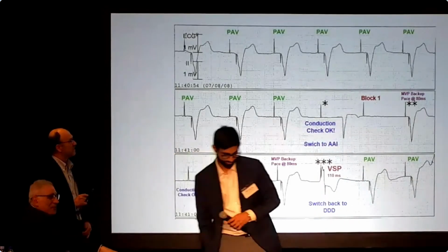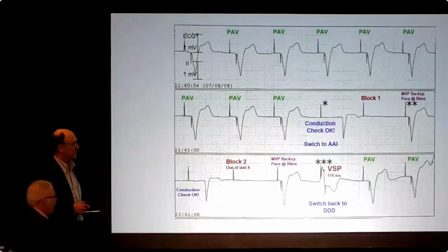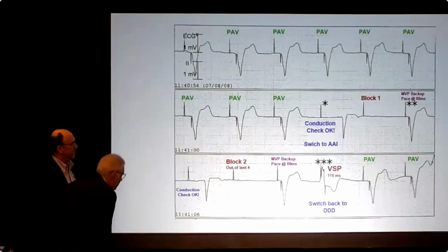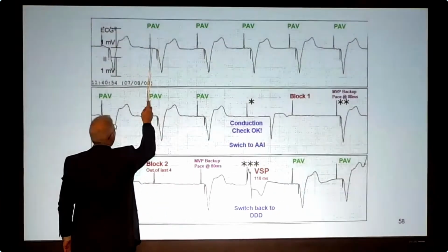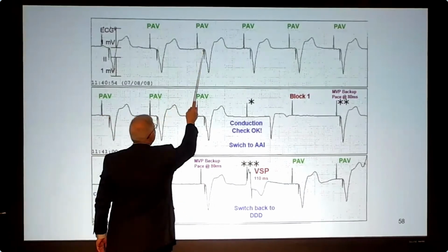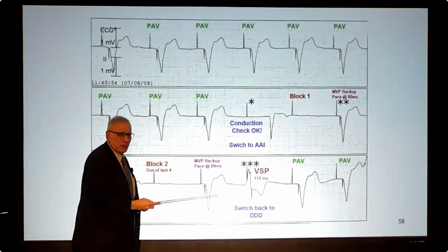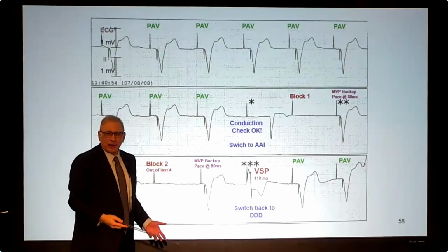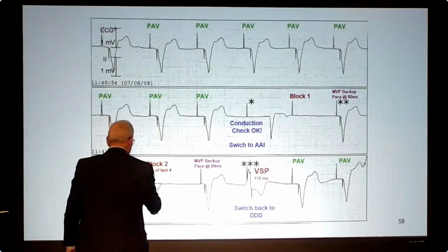But I'm just telling you, if I were reading this, I don't have anywhere near your sophistication. I'm just going to fess up like George did before. I'd look at this and say, I don't see a P wave there. Like this is flat. I don't see a P wave there, and I'd start to wonder personally, am I really capturing anything? Just me. And then I look down here and I say, look at all these little squiggles.